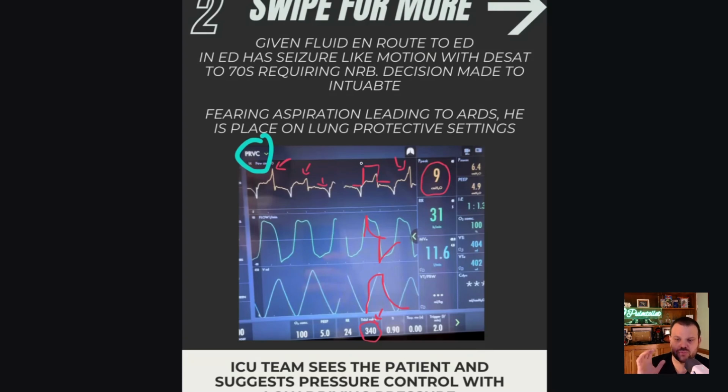Because in this waveform, there are multiple dyssynchronies, not the least of which include delayed cycling. That's what you'll see in delayed cycling. A hallmark of it is that in the pressure waveform, there's a spike towards the end, which is a rise in the pressure towards the end of the breath. That could mean that the patient's trying to push against the ventilator to get it to cycle into expiration. And you see that represented in the flow waveform. So let's take this one, for example, the second one. Here the patient's essentially breathing in this whole time, just pulling flow almost in a straight line, but then towards the end of it just blows out tremendously to try to get the ventilator to cycle.